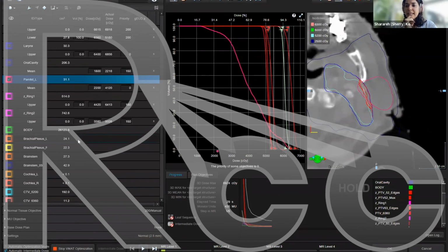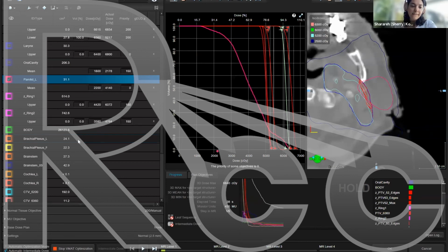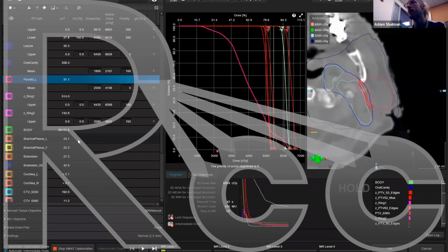And Anissa is asking about SRS plans, and do you have a special method that you use for your SRS plans, and how much dose falloff do you usually get? Good question. For SRS plans, we'll have a whole course on SRS SBRT that we're working on. I'll be providing a different document for planning SRS SBRT, but typically you can have much sharper falloff. Without going into too much detail, for example with smaller single met lesions, I'll use my rings, with a ring 3 millimeters away.